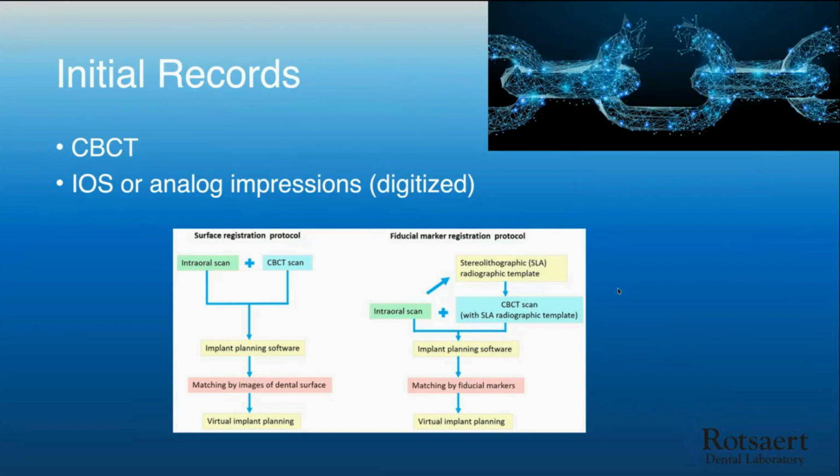We actually connect them, or what they call matching, of those two components, and I'll show you that in real time. But once we import them, that gives us the tissue positions, the tissue contours. It gives you the actual teeth, so we can do a diagnostic setup of the edentulous spaces and know exactly where we want to go when it comes to the final restoration.